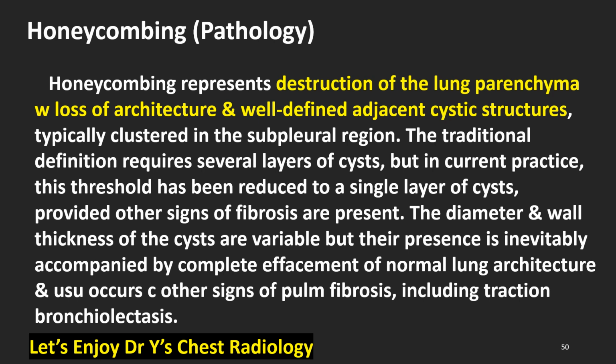The diameter and wall thickness of the cysts are variable, but their presence is inevitably accompanied by complete effacement of normal lung architecture and usually occurs with other signs of pulmonary fibrosis, including traction bronchioloectasis.